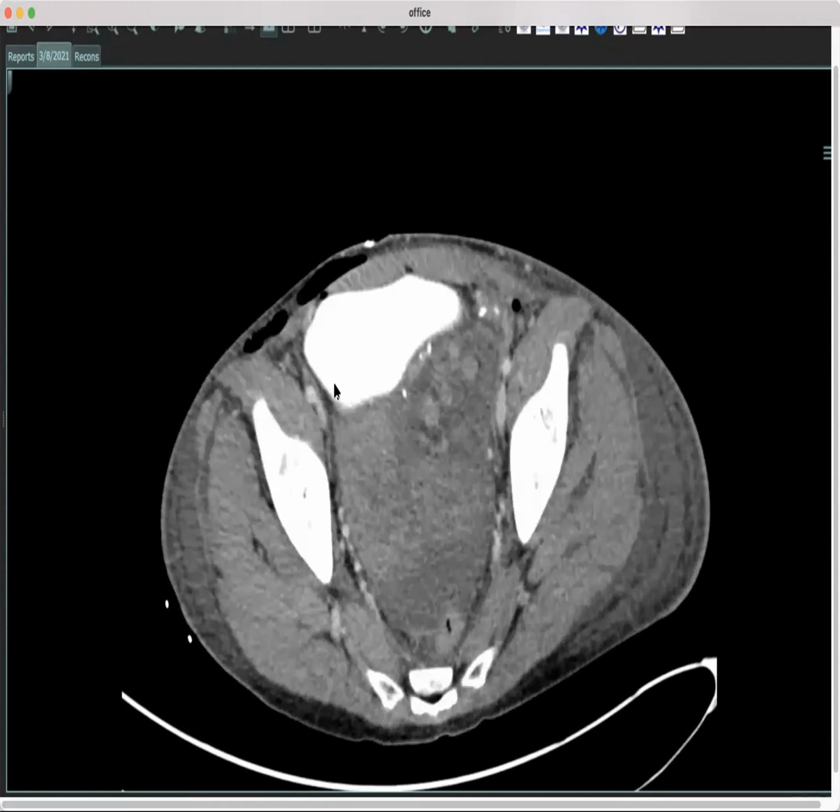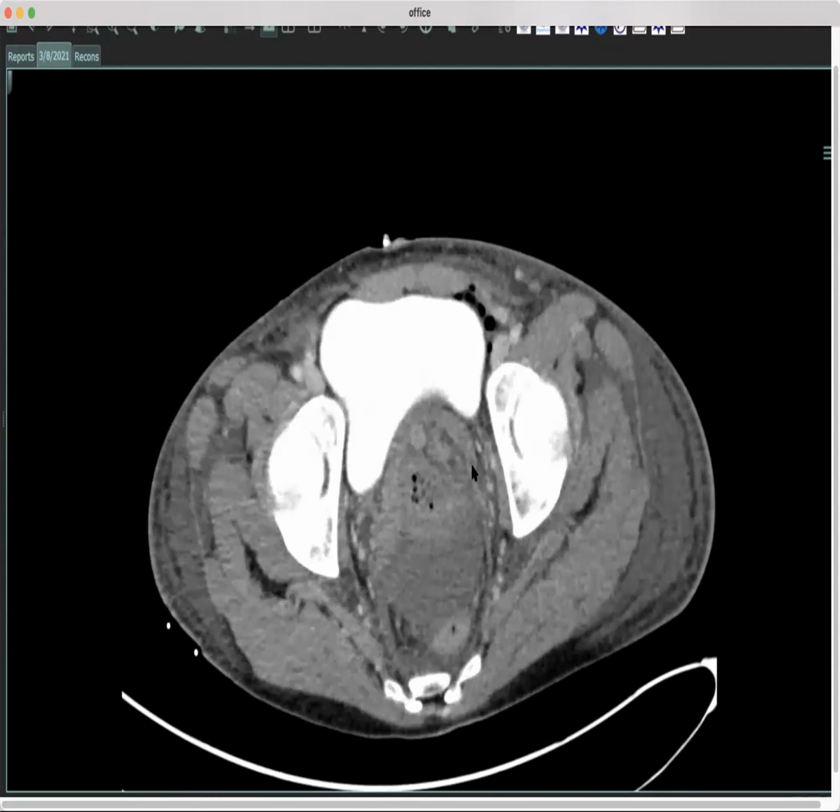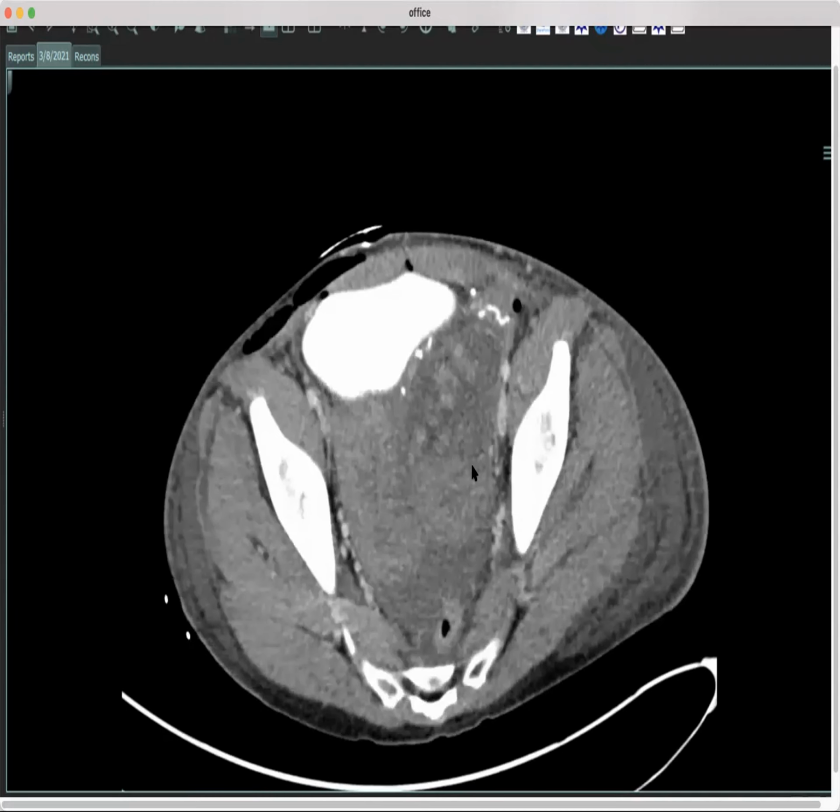And so unfortunately, this woman lost like 60 centimeters of small bowel in an attempt to create a neovagina, and I'm not really sure what the next steps will be. But apparently it is a pretty complicated surgery that can cause a lot of problems like this. Ross, I just have so many questions, but one of my questions is: is that whole 60 centimeters of bowel supposed to be the neovagina, or is there one portion of it that's the neovagina and then the other small bowel that was dragged along in the process got ischemic?